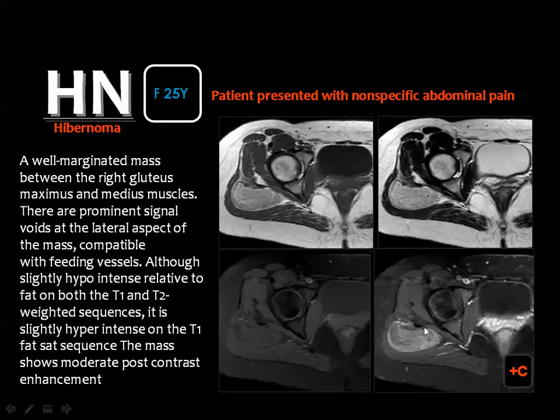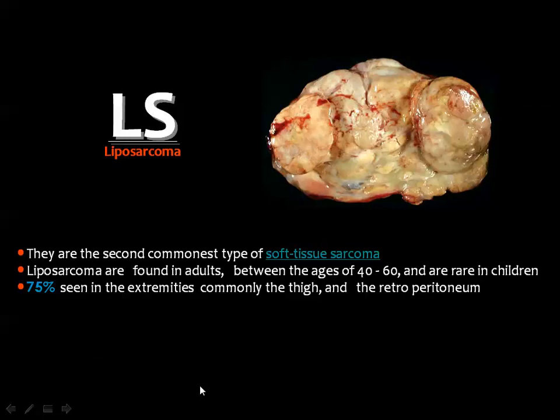After contrast enhancement, lipoma does not enhance, but hibernoma will show enhancement. This is a hypervascular lesion.